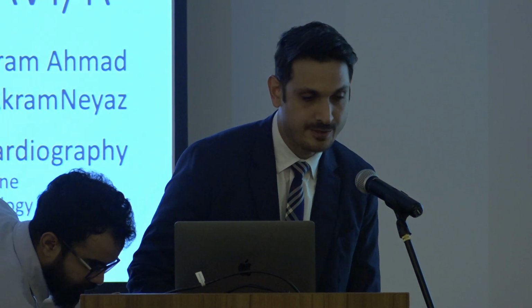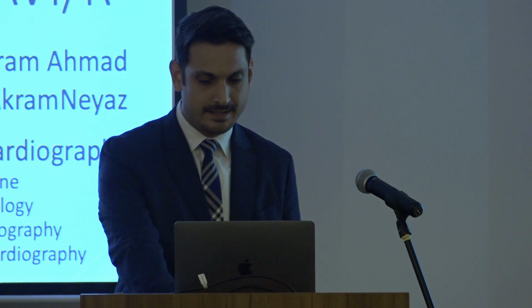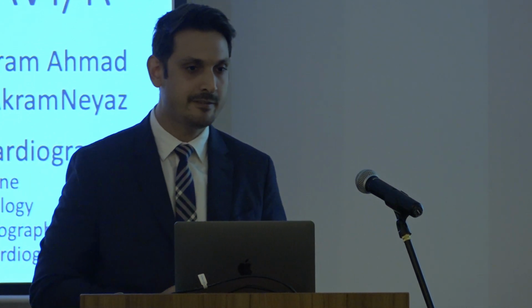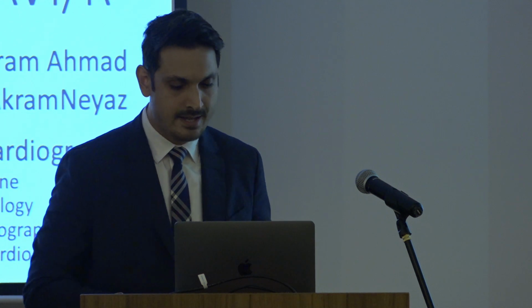Okay, so Assalamu alaikum everyone again. My talk today is about aortic stenosis evaluation after TAVI or TAVR, and I'm going to start with a case. This was a 65-year-old female who had symptomatic, very severe aortic stenosis.